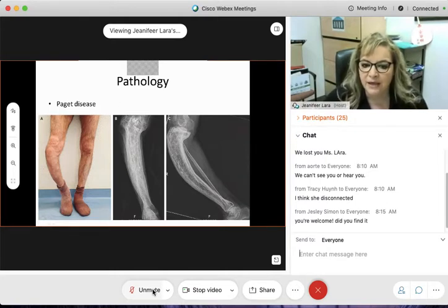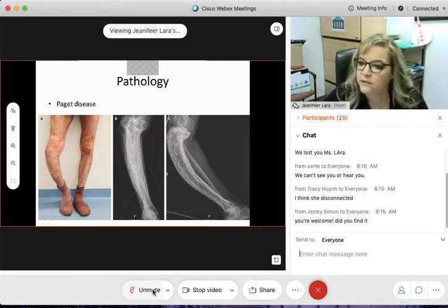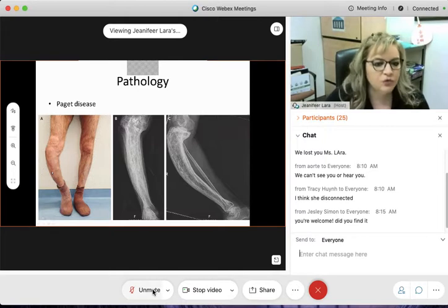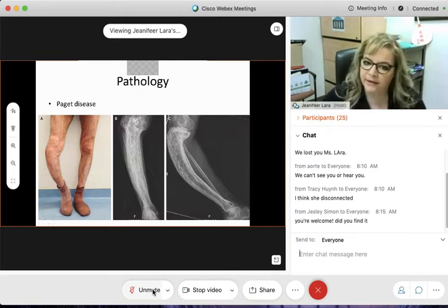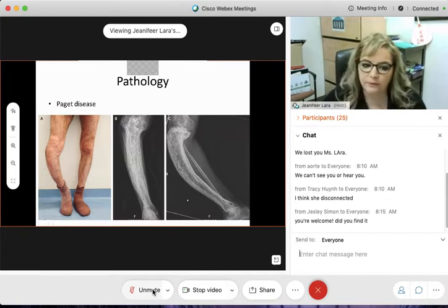If you continue to walk and the bone is soft, you start to mold the bones. So this is why you're able to see this anomaly from this patient compared to the normal side. So this person has an obvious Paget's disease because we can see that deformity. That is not usually occurring from a big break. That is the remodeling, the reformation of the bone, soft bone.